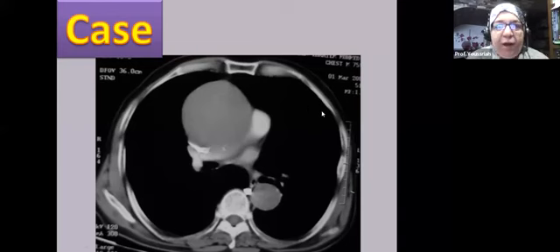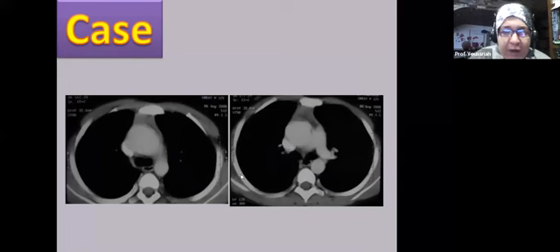When we find an aneurysm in any artery, we should describe its extent. We should describe if there is thrombosis, if there is dissection, and its maximum caliber, and the arteries involved in the aneurysm. These are all points that should be covered. Now here, in another case, again, we have focal dilatation of the anterior aspect of the arch and of the ascending aorta, okay? But this time it's a 12-year-old male patient.